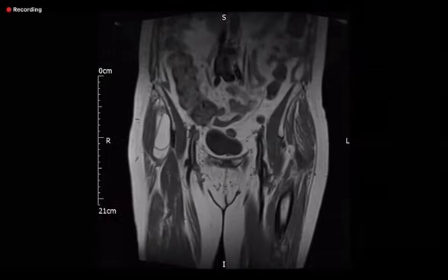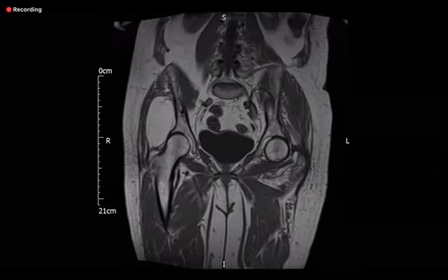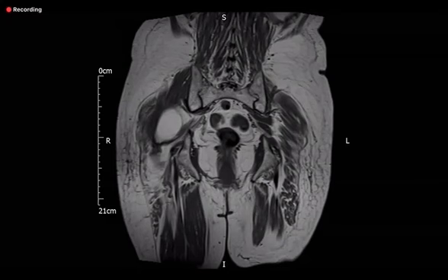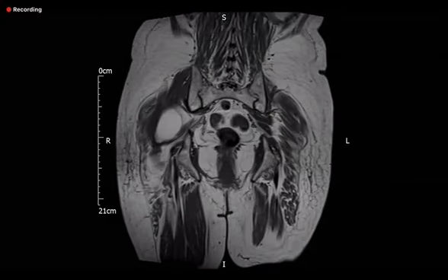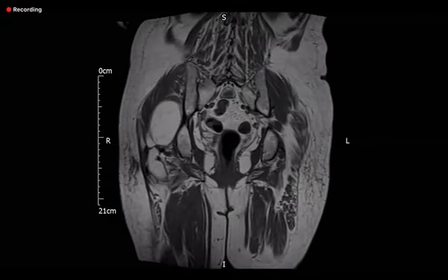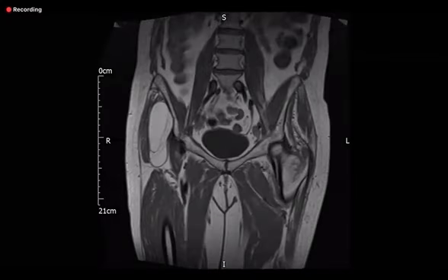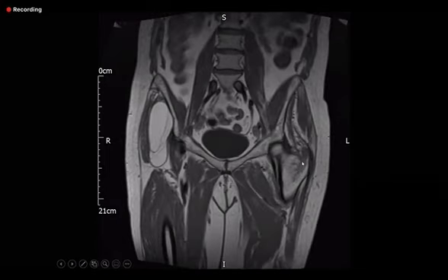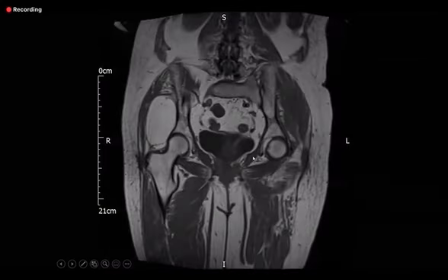Okay, so what I said earlier is that the previous one was a fat suppressed sequence. This is non-fat suppressed, and it demonstrates high signal intensity within this lesion on the right side. And looking at the left greater trochanter, I think there may be a fracture there actually. Right. Next series, please.